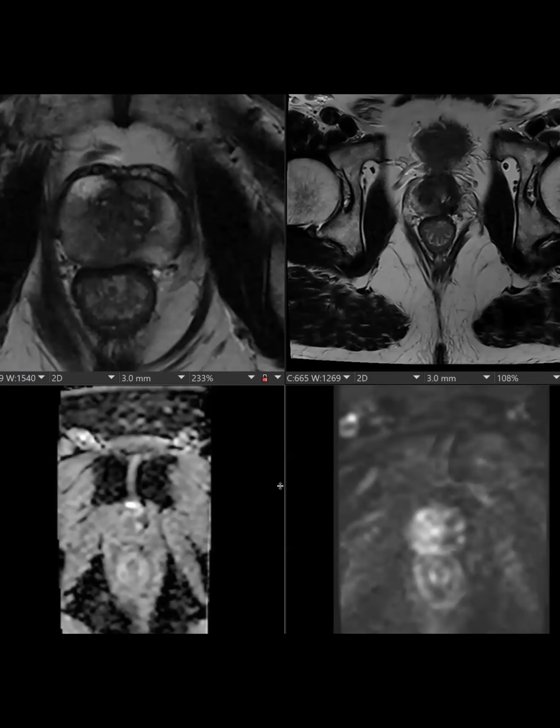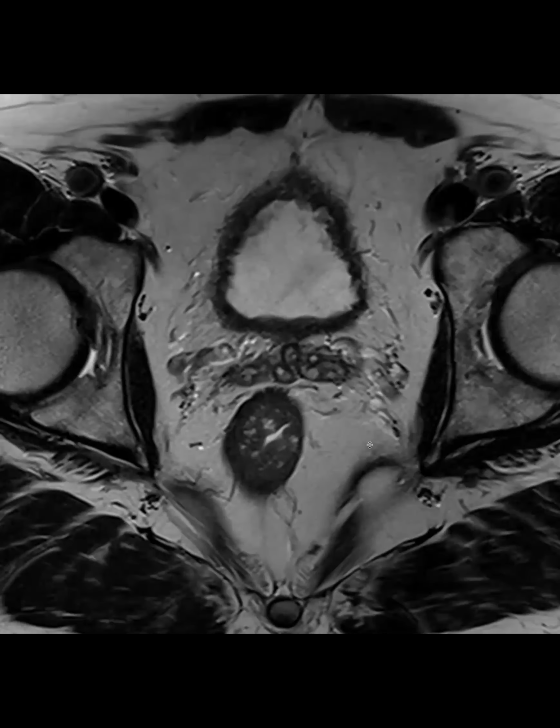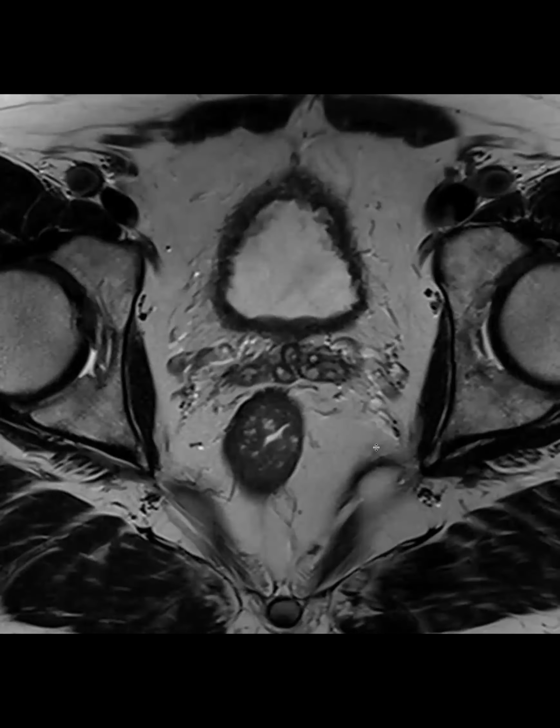And show the bladder, because you said they're on BCG, presumably for a bladder tumor. Here's a bladder. Yeah, they've been getting TURBTs and stuff like that, but there's no current bladder mass that is apparent.